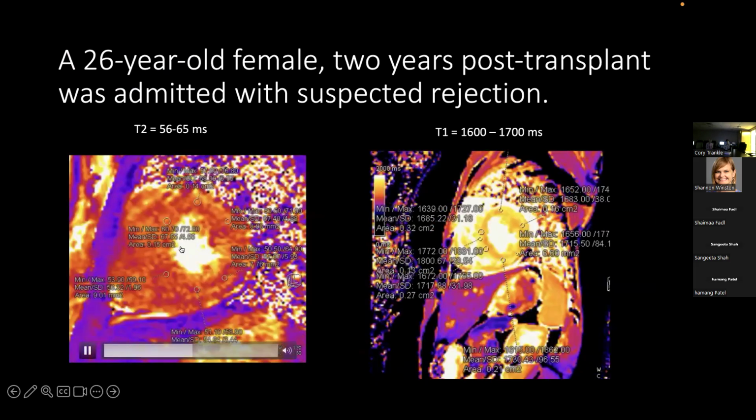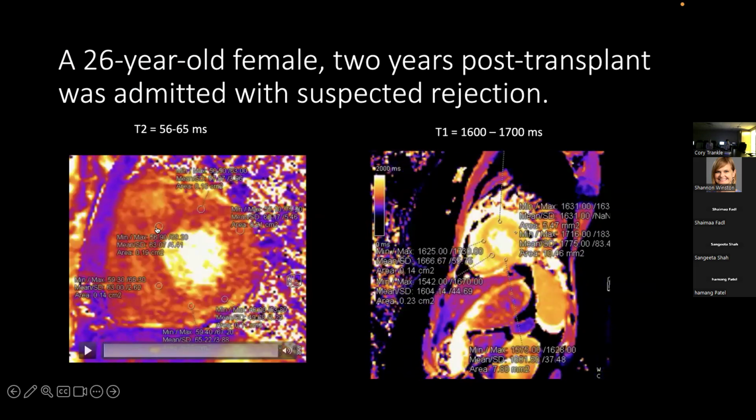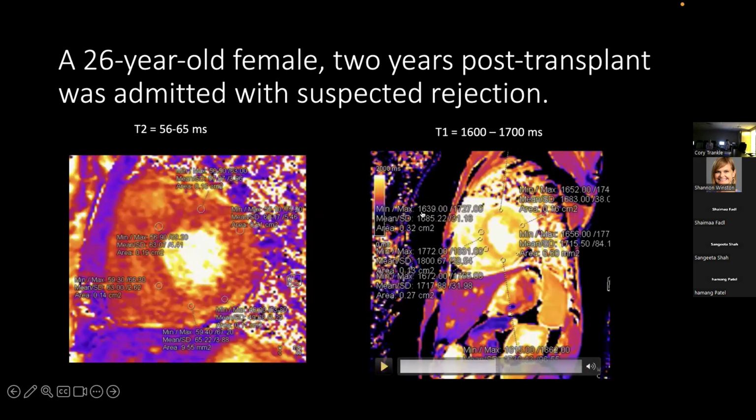T2 values were elevated on 3 Tesla. It's 56 to 65. If we look at the base, this is 56, 63, 65. And the T1 values were elevated, like 1600. It reaches 1700 in some areas.